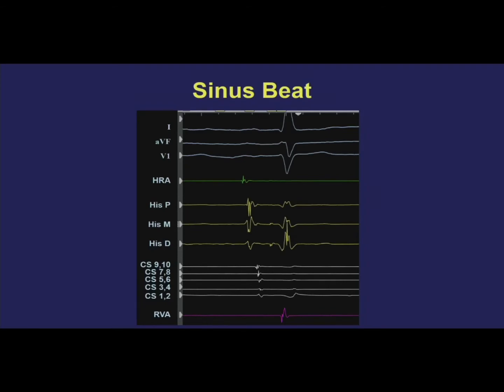But you do want to use the signal right in the His catheter so that you're recording local atrium just above the AV node right nearby and not somewhere else, so you're adding in transatrial conduction time into that measurement. Yeah, so another good question. These are terrific questions. They're really important, basic questions that a lot of fellows don't ask, so keep them coming.